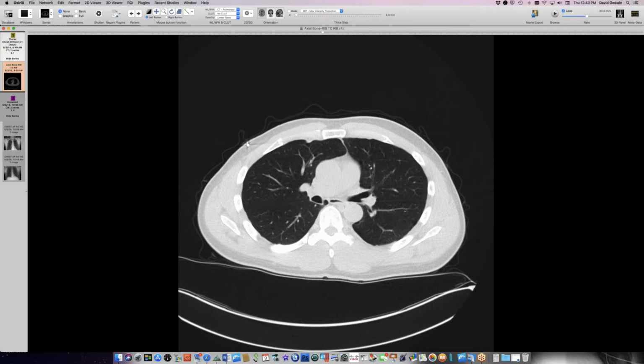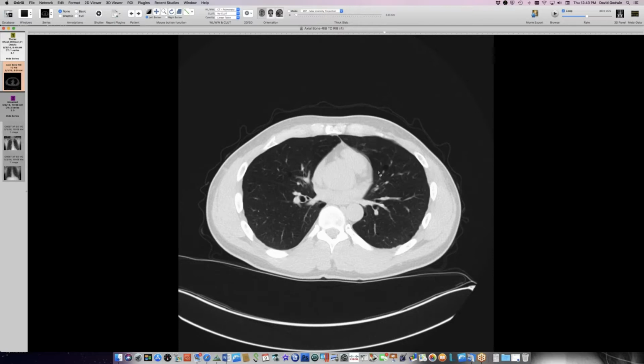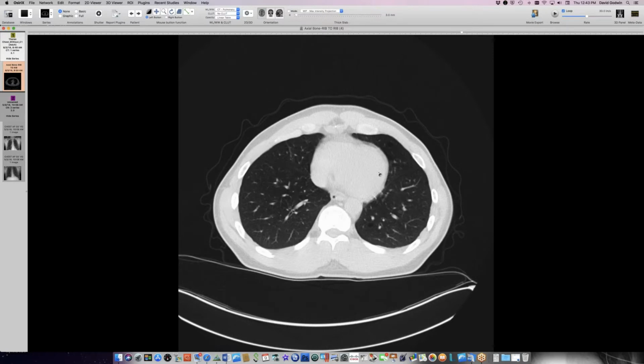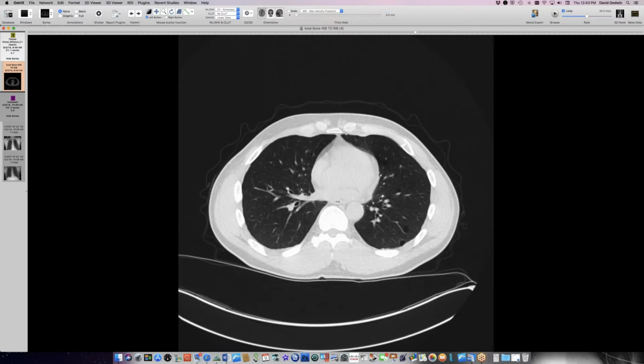But the intriguing concept, and what I would love this to be, and I think this would please Howard as well, is could this be the LIP that goes with HIV? They're very clean cysts and stuff like that. So perhaps that's the case. I would love this to be LIP because I don't have any cases of LIP in the setting of HIV. It's supposed to be more in children, but this would be lovely if this were an adult case.